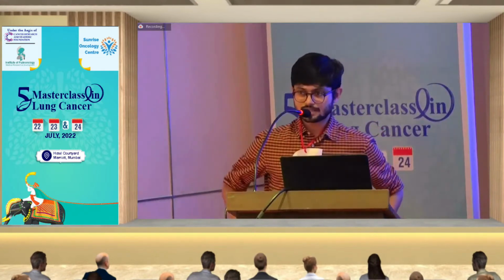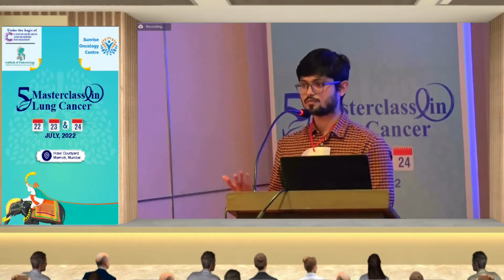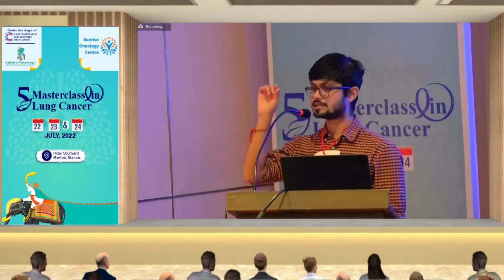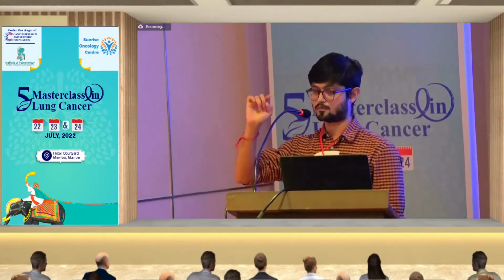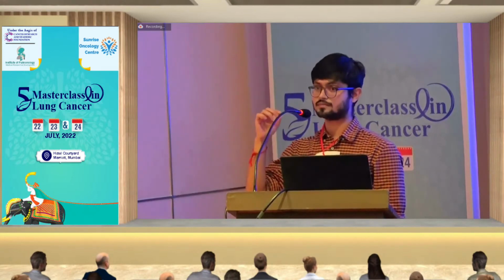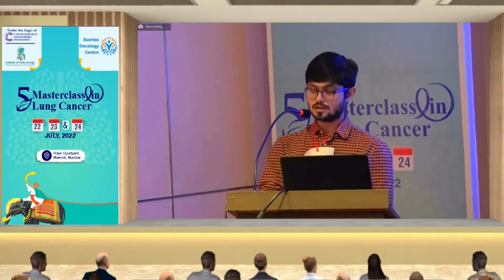It is a bit difficult, because if you don't have access to all the images or raw data, it may be difficult. So you have to contact your radiology or nuclear medicine colleagues. But if there is misregistration, like we are seeing uptake here but the nodule is there, then obviously that uptake more likely corresponds to the nodule. Sometimes when we see the scan, before we send the patient, we may take another scan if we are having confusion, so that it will be registered. Most often this kind of misregistration happens in the supradiaphragmatic and subdiaphragmatic region due to respiratory artifacts.